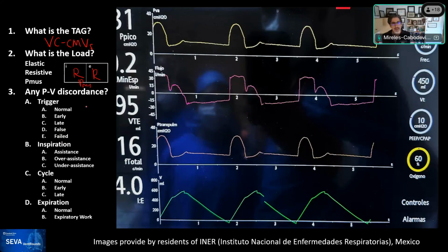And then you have the PV discordance. So what do we think about the trigger? There you go. Right at it. Demonstrating fellow power. Megan, Alicia, Arsal, Alejandro, great job.